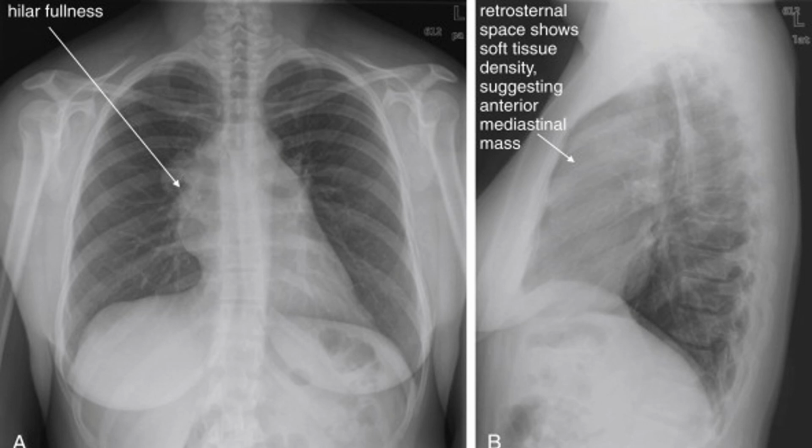Here you'll see how full the hilar space is altogether. It almost looks like that sail sign, like an old sailboat triangle, like the thymus sign that you see with little kids. It's called the sail sign. It's a sign that the hilar space is really filled. And then you'll obviously see that mass, or see how dense this is. Instead of having a bunch of gas here, right, we see just how dense and full this is on the lateral chest X-ray. So that's a bad sign, right?